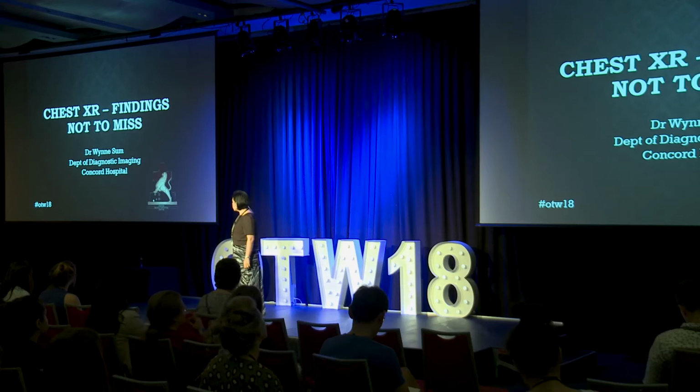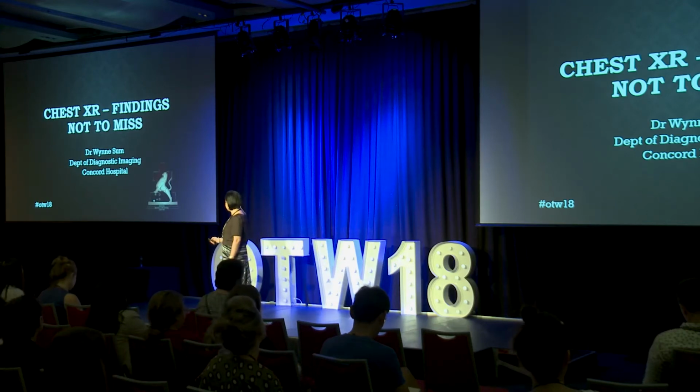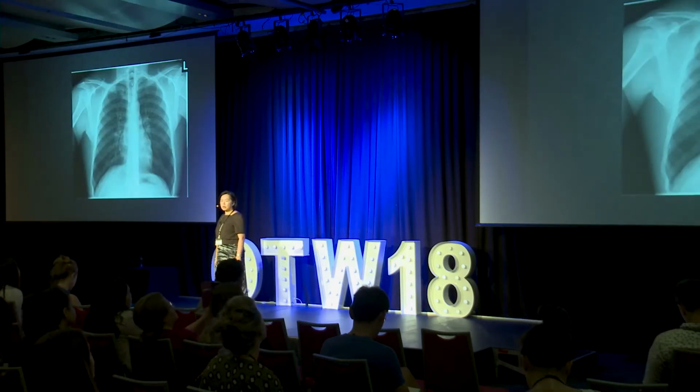So I've divided the talk into two parts. The first part is mainly about how you approach reading a chest X-ray and the different projections you could ask for when you write on your request form, depending on the clinical scenario. In the second part, I'm going to present some clinical scenarios with the accompanying chest X-rays, and we'll run through what you should be looking for and what not to miss.